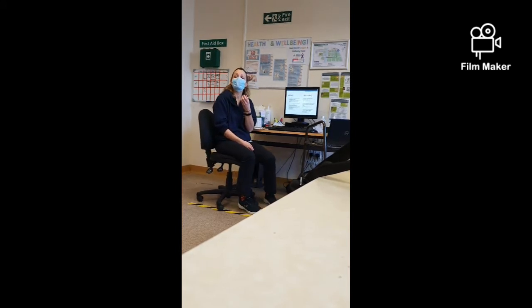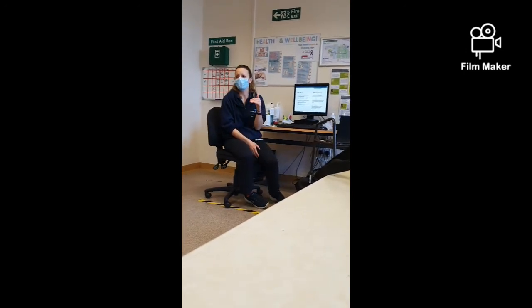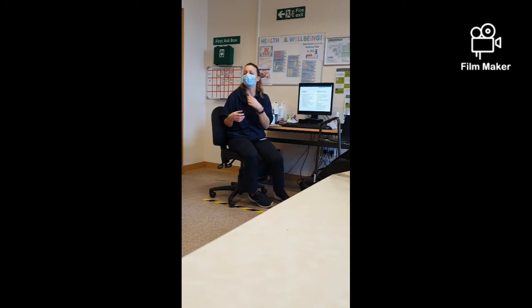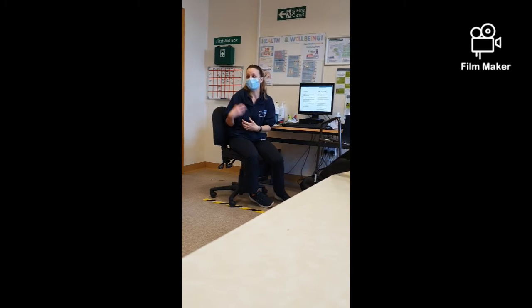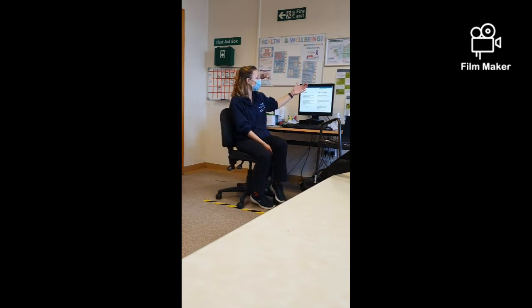Is it other factors that you'd look at to see if it's a push or a pull? I know that might sound like a silly question. Yeah, so even if your trachea is deviated, you would still go through the A to E approach. And look at things like, are the lung markings towards the edge of the lung field, which would also indicate whether it is a collapse or a pneumothorax, but we'll go through that.